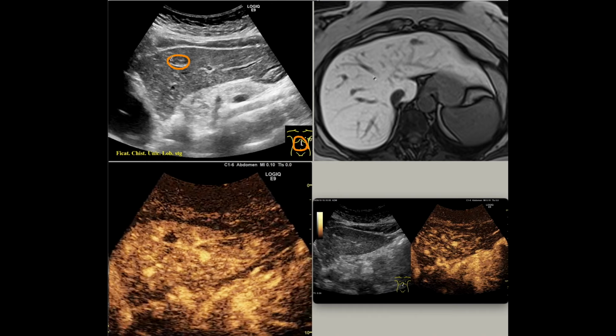When such a lesion is detected, the next step is more advanced, sectional imaging. MRI shows us a lesion that is hypodense and could be a fluid formation. It is an easy image to understand because it is anatomical in nature, whereas the ultrasound examination is a focused examination of an anatomotopographic region. Again, returning, the next step for completion is back to ultrasound.